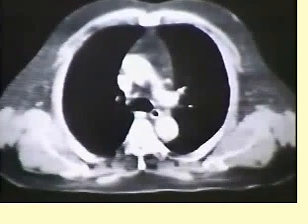But notice that the first thing you reach when you come down from the aortic arch is the top of the left pulmonary artery. It is the highest part of the pulmonary circulation.